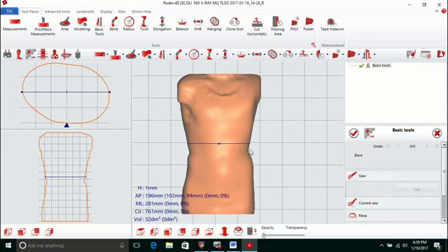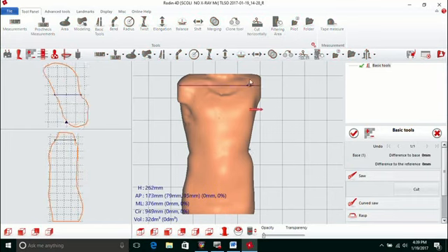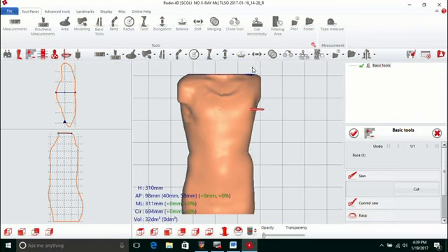Now, if I select saw tool, I left click, hold down, release, the arrow indicates the direction of the cut, the material that's going to come off the model. Now, if I use my cursor, left click at the tip of the arrow, it removes that material.